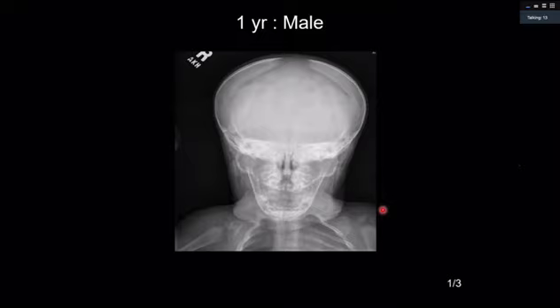Yeah, the chest wall seems abnormal too. That is a correct observation. But I was saying anything else in the differential diagnosis from the congenital world. I don't have anything on my mind.